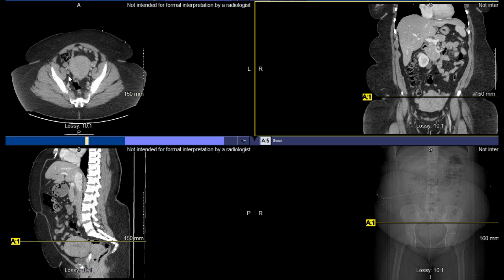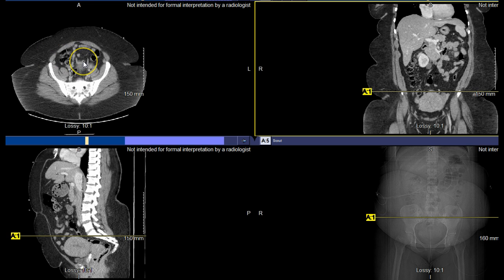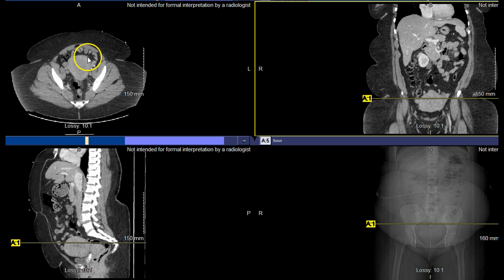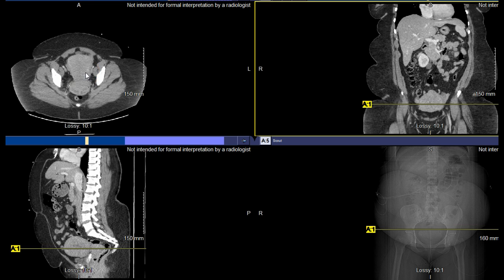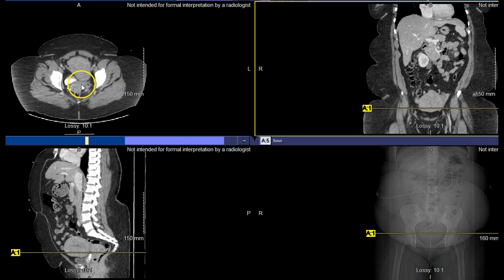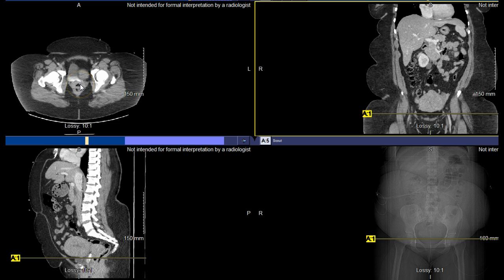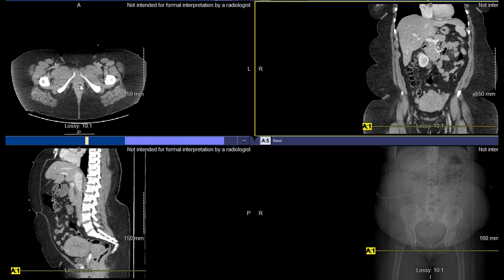As we continue to go down, you can see where the patient's bowels are, and kind of working down. The very first thing that we're actually seeing here is the uterus. So that's all uterus, and let's just continue to follow it down. This posterior area back here is also uterus, and as it transitions down, this is more of the fundus, the anterior aspect of the uterus, and this would be as it transitions to cervix and then to the vagina.